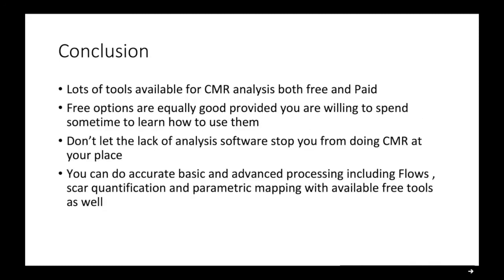So in conclusion, in this video we have discussed a lot of tools which are available for CMR, both free and paid, and we have seen that free options are equally good provided you are willing to spend time to learn them and use them properly. And the important message will be, don't let the lack of analysis software stop you from doing cardiac MRI at your place. You have freely available tools which are easy to learn and implement in your workflow so that you can start doing cardiac MRI at your place.